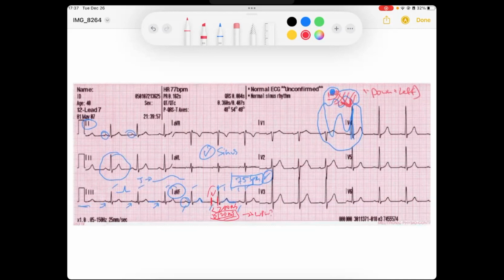So I see that this PR interval is good, but I'll just scan throughout and I say, okay, good. Okay, good. Maybe over here, good. And the fact that I'm seeing QRSs occurring throughout even adds more evidence that there's no AV node dysfunction or AV block in the sense that there are no dropped beats. So remember, if you understand cardiac physiology, then this is going to make developing a differential diagnosis as you're going through these steps much easier.